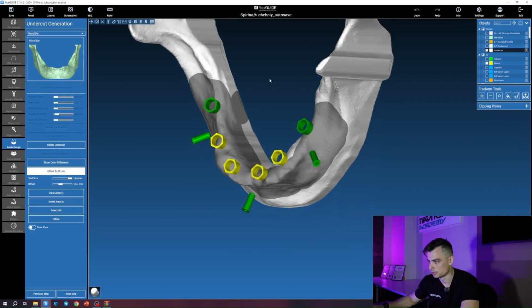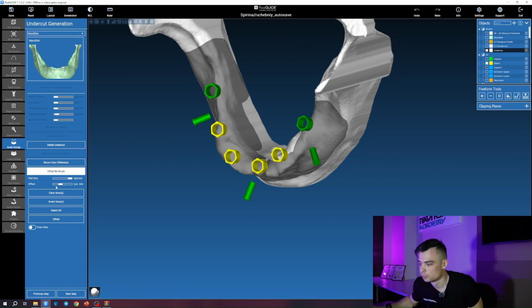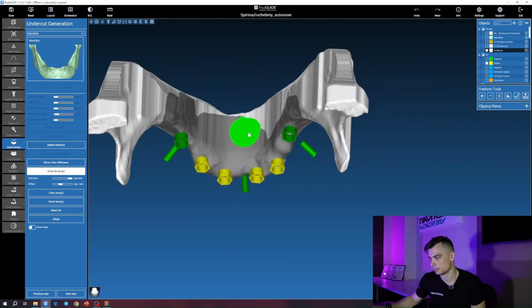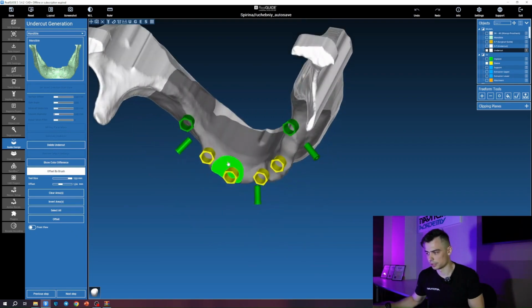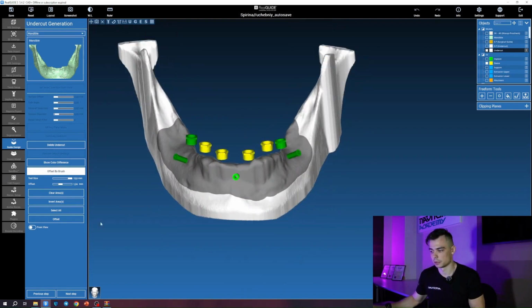We coat it, and wherever we apply it, the program will create a gap equal to the offset value we've set. Here, I currently have it set to 1.24, but generally you shouldn't make it less than 1 millimeter. Why is this necessary? Yes, your template will most likely be slightly separated from the bone by literally 1 millimeter. This will not affect the fit in any way, nor will it impact any of its strength characteristics or the balance, but it will protect you specifically from CT scan inaccuracies, because a very common problem with bone-supported templates is that they don't fit properly.